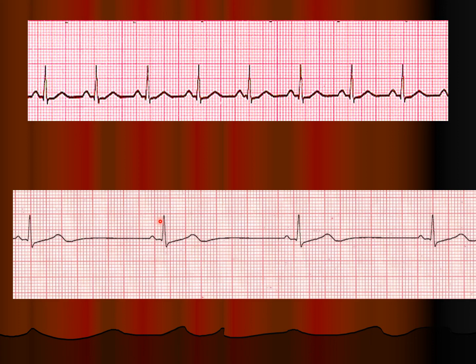And if we were going to do, I haven't done this ahead of time, right? So 1,500 divided by around 43, it's lower, right? That's lower than 40. So you're like, huh. If it's lower than 40, you technically cannot call this a sinus bradycardia.